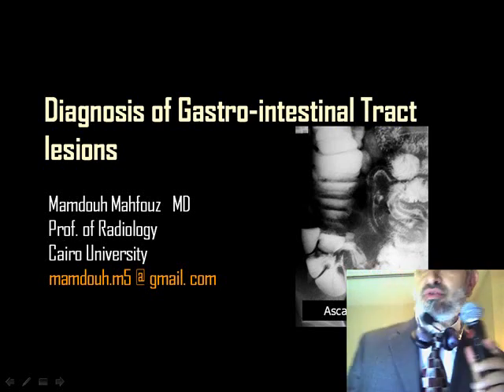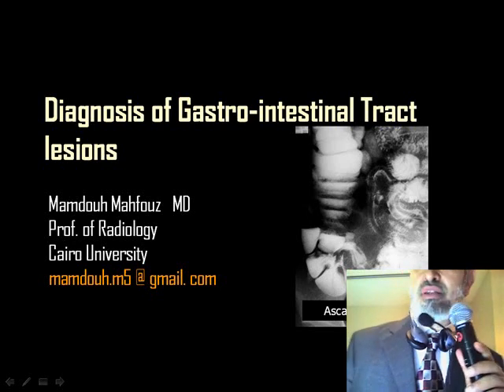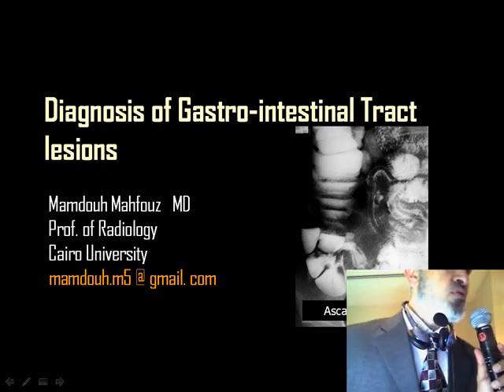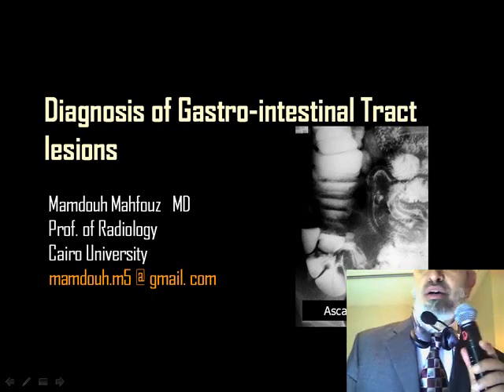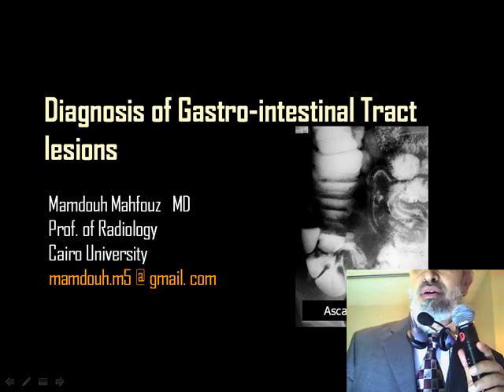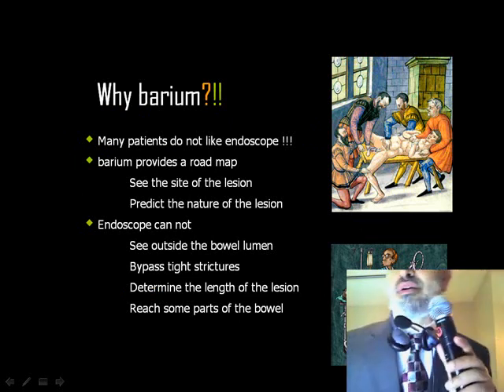And this is just to test your look at the barium studies. By the end of this talk I will present a few cases, and I will ask you to answer the images.